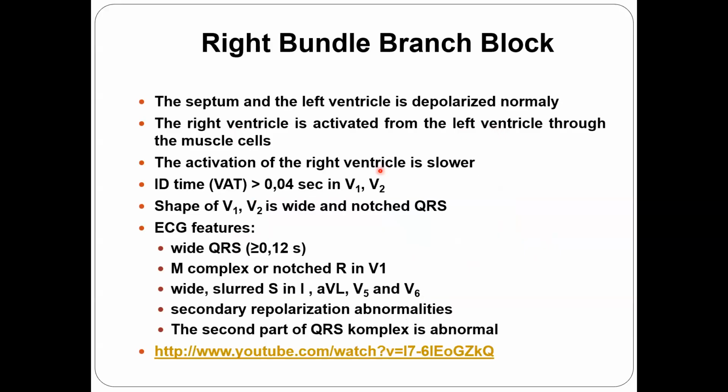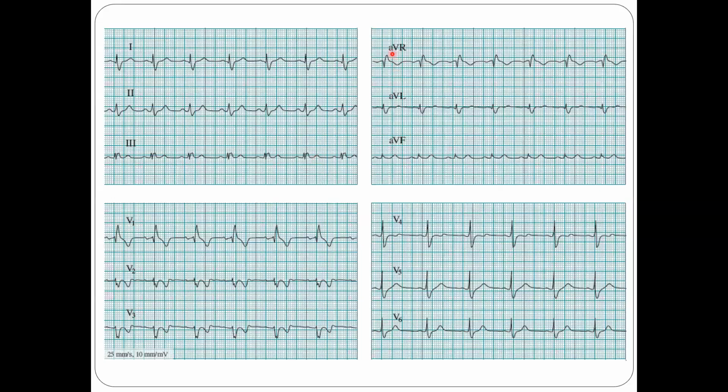Okay. I don't want to talk too much about the very simple one, and you can diagnose it by looking at, for example, V1 or looking at the left side, lead 1 or V6. You do see that very slurred and wide S wave on the left side and a tall R wave in V1, for example.